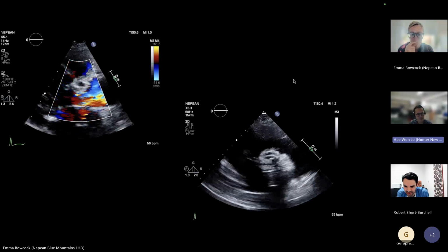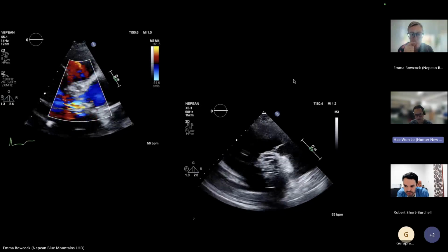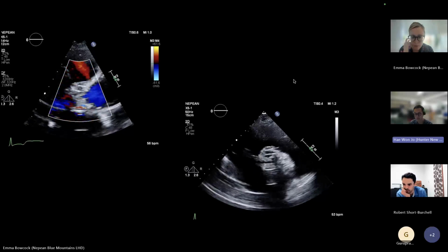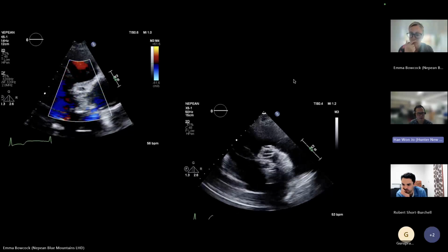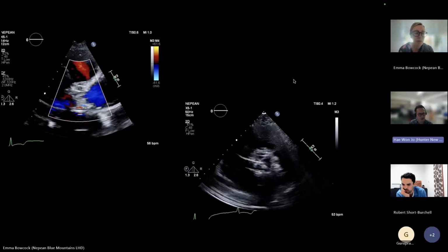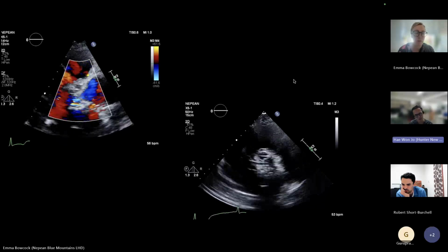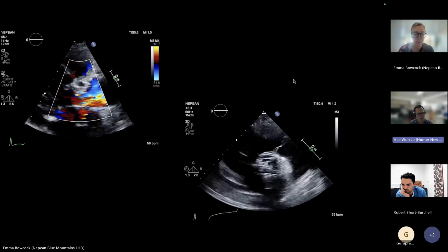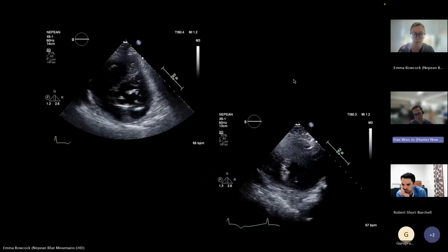Again, I think it's most likely to be a bioprosthetic aortic valve. There's no extensive acoustic shadow associated with metal valves. On color flow Doppler, there is an eccentric regurgitation with turbulent flow upstream. I'm concerned about a paravalvular leak with this color Doppler.